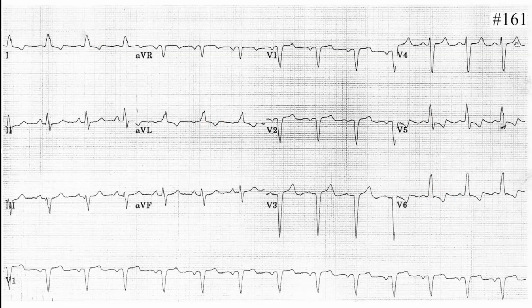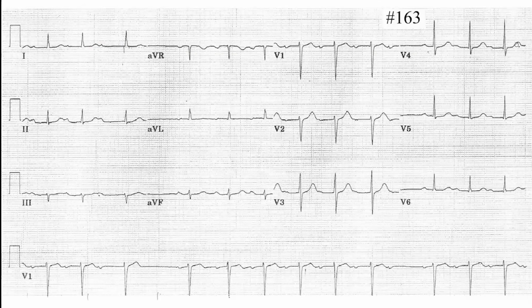Okay. Now let's see. Ankit, are you here? Yes, doctor. Thank you very much. Okay. Now it's your turn. Okay. So I think it's arrhythmic. And the heart rate is... you can see it's around 60 again. Yeah, it's okay. 60, 65.